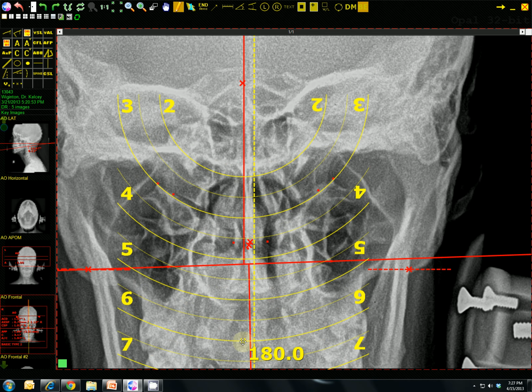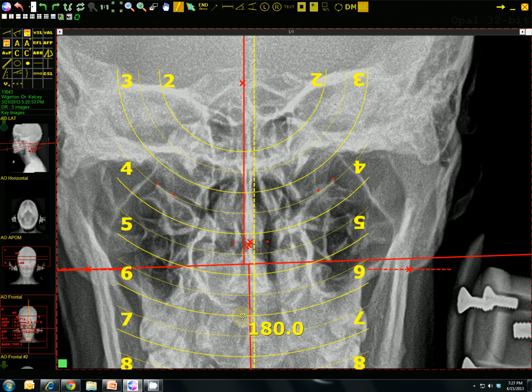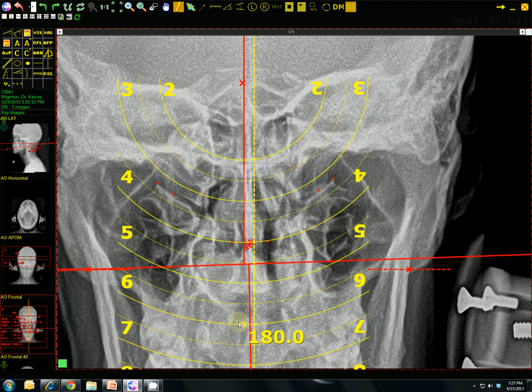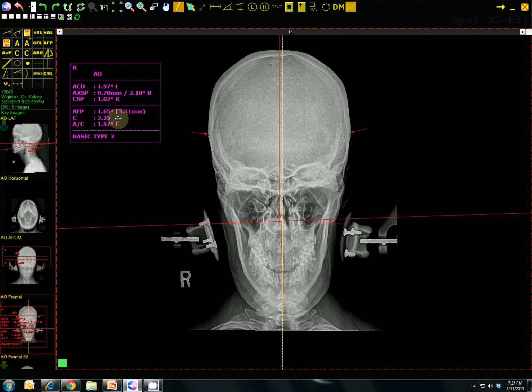But what we want to do is see if we can get a line perfectly fit along each of those circles. So it doesn't quite fit for the 3 and also doesn't quite fit for the 3.5. So it was right in the middle, so 3.25. So I press question mark, enter in 3.25. At that point, you can see the C is now 3.25.